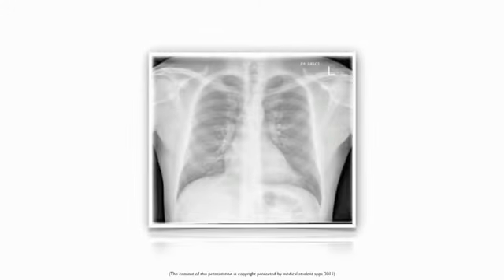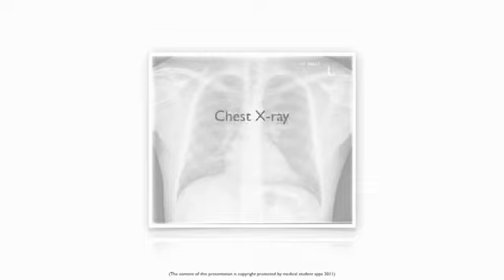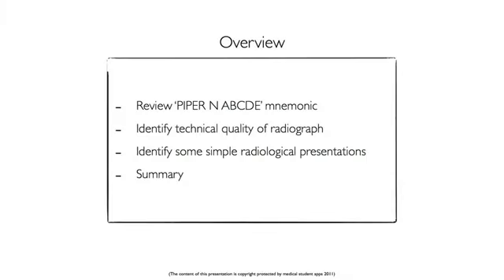Welcome to Medical Student Apps, Chest X-ray Interpretation. In this video tutorial, you will learn to apply the Piper N-ABCDE mnemonic to assess the quality of a radiograph and identify simple radiological presentations. We will now begin by reviewing the Piper N-ABCDE mnemonic.